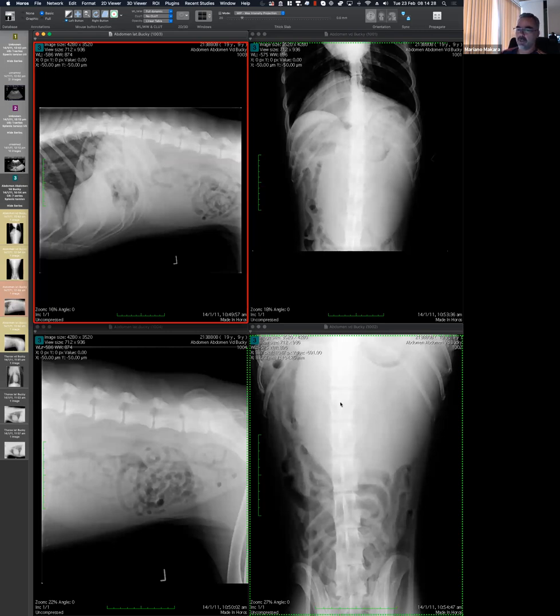There is no reason why the small bowel is occupying almost the entire abdominal cavity, and then for some reason there's not a single bowel loop sitting here. I hope you can see my arrow. There's nothing sitting here. So I think we have the right to call it mass effect, whatever.